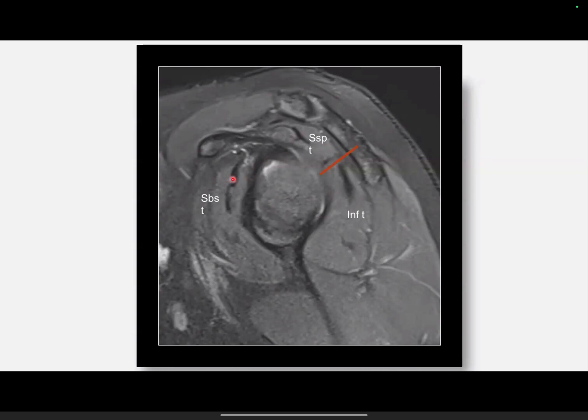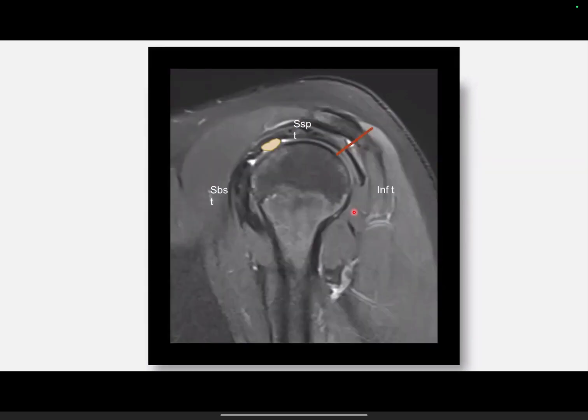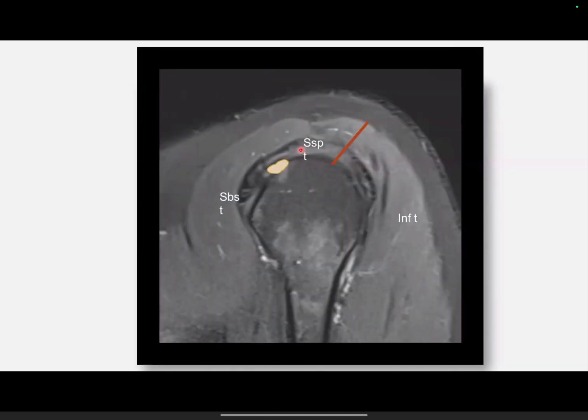So here you can see this is subscapularis, supraspinatus, infraspinatus. Now we are coming from medial to lateral side. So you can see these are the myotendinous junction. This is infraspinatus tendon. This is teres minor and supraspinatus. So here you can see supraspinatus, infraspinatus. So this is anterior or horizontal facet. This is oblique facet to attach infraspinatus, and this is inferior facet for teres minor. And for subscapularis, this is lesser tuberosity. It will take a broad attachment on the lesser tuberosity.